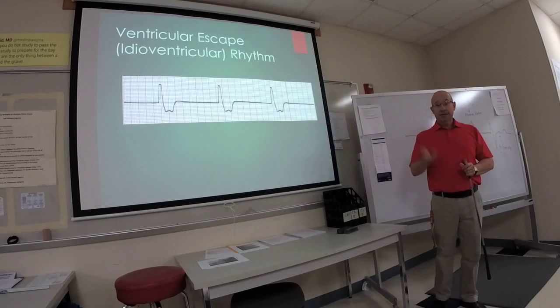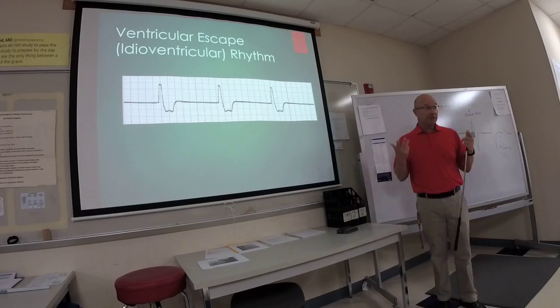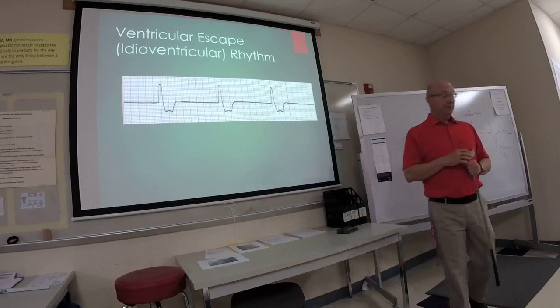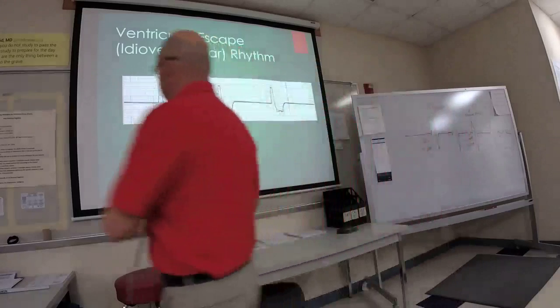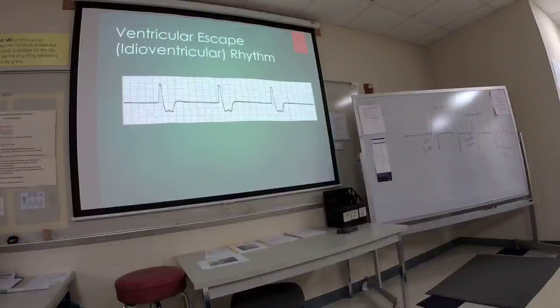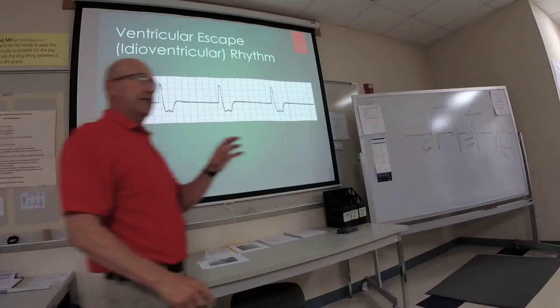But more than likely you don't start compressions there. They need to speed up the rate. They need to figure out what's wrong with the SA node. But this is sort of a last ditch effort for life. But you're going to get your workout there because you're going to start compressions. So that's the idioventricular rhythm.